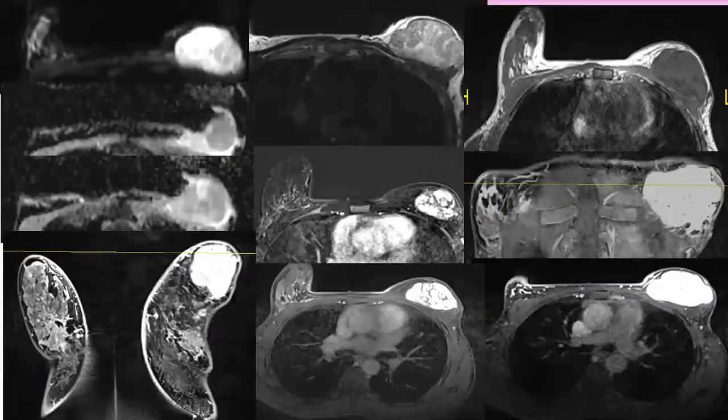However, this time it demonstrates a change in character on MRI. Not as very low as the first one on T2, it is now of intermediate heterogeneous signal intensity and demonstrates multiple non-enhancing septa within the lesion, and is circumscribed.